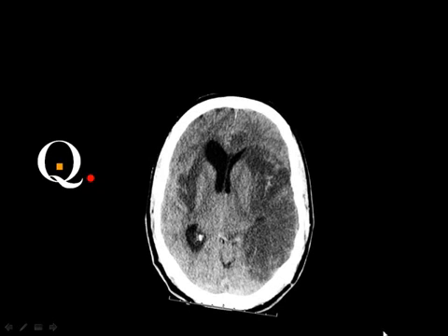What do you think of this? Left infarction, acute, right? Actually, this ventricle is compressed, then you know that this is acute infarction. But you don't know if this ventricle is normal, because the patient had some atrophic changes, or if it is dilated secondary to the presence of this area. Then we consider, if they have the same density, we consider them as both acute infarctions.